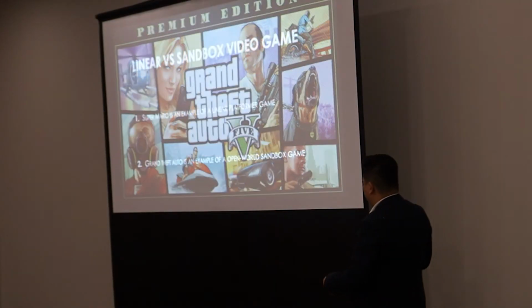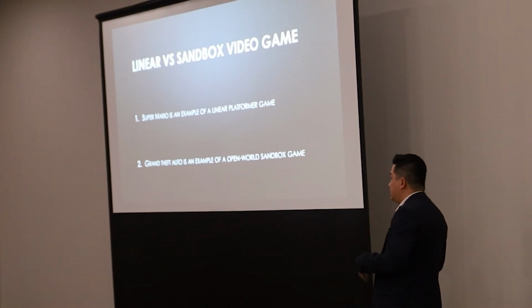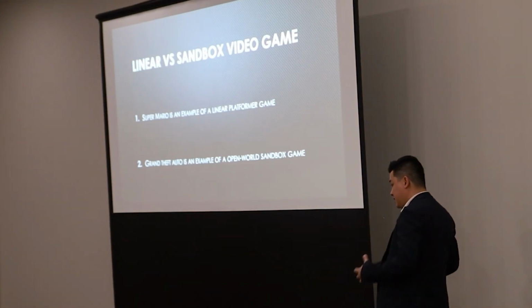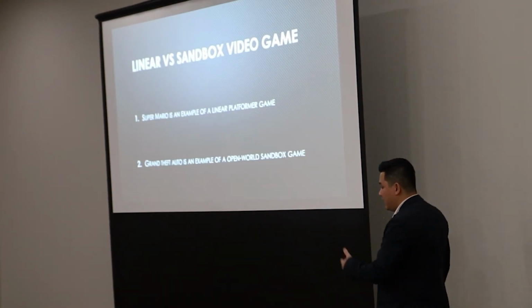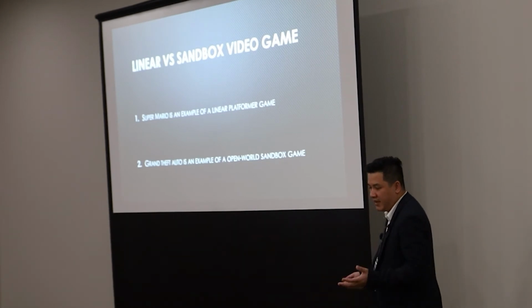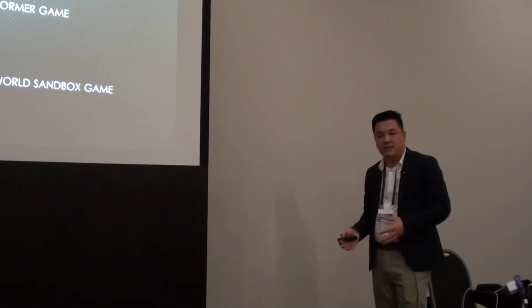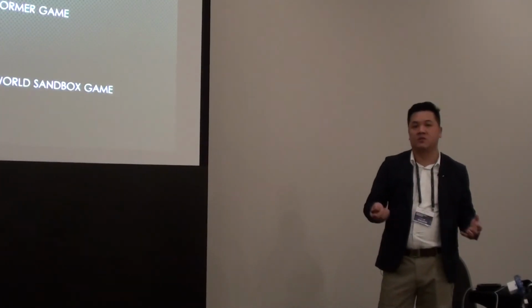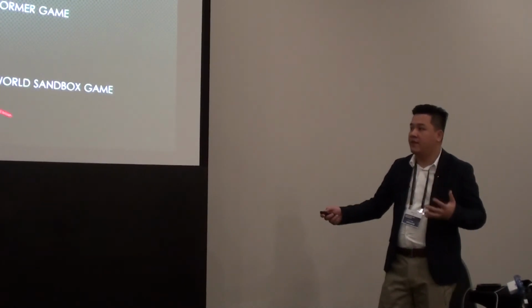So with 3shape, when we're taking on these advanced, complex workflows, we really want to stop playing Mario with 3shape. It's very good, it's designed for that. It's very linear, it allows you to produce. If you follow those indications, that's kind of why it's a testament to its success as a CAD program. But if you're in the edge cases where I spend most of my time, you really do want to play Grand Theft Auto more, right? So as you saw in my previous design there, I designed the teeth, went back, sculpted the denture base, removed the teeth, go forward, add a scan, and so on and so forth until I found my final product that I was happy with.